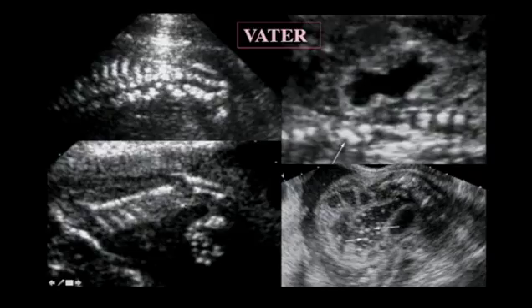So let's see some examples of these. This is Vater's association. They have vertebral body abnormalities. They have hydronephrosis. They have a short radius, which is why the hand is coming forward at a 90-degree angle instead of at the end of the forearm. And this area here, this is dilated loop of bowel with intraluminal calcifications, and those are pathognomonic for a mixture of meconium and urine, which occurs when there's a fistula between the rectosigmoid and the bladder, and that invariably is a sign of anal atresia.